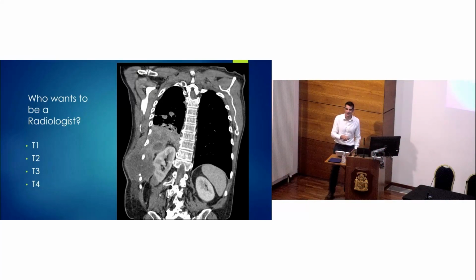Now, this is great because now everyone's sitting slightly apprehensively. I hope he's not got another case. Well, I do have another case. But anyway, so here is a tumour bulk here, and you can see it very extensive. This is very gross, isn't it? Into the chest wall. We've got probably rib destruction here, and Kevin's right. I think it's probably going to be into the kidney itself there. So advanced T4 disease. Well done, all of you. So this is another one. It's maybe a wee bit more difficult.